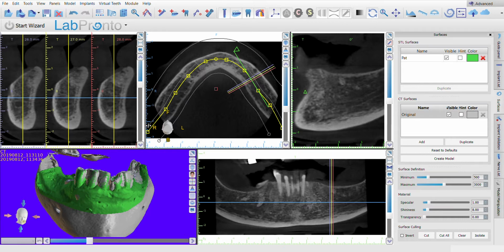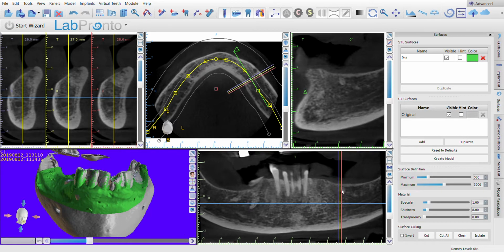So going back into our windows in these areas and what we're looking at, the other thing that I wanted to mention to you is when you're looking at your panoramic view, you have these three lines. It's a red, yellow, and a purple color. And these red, yellow, and purple colors correspond to these cross-sectionals, which is red, yellow, and you can look at the numbers, and a purple. Okay? So a blue corresponds to this line on a panoramic view.